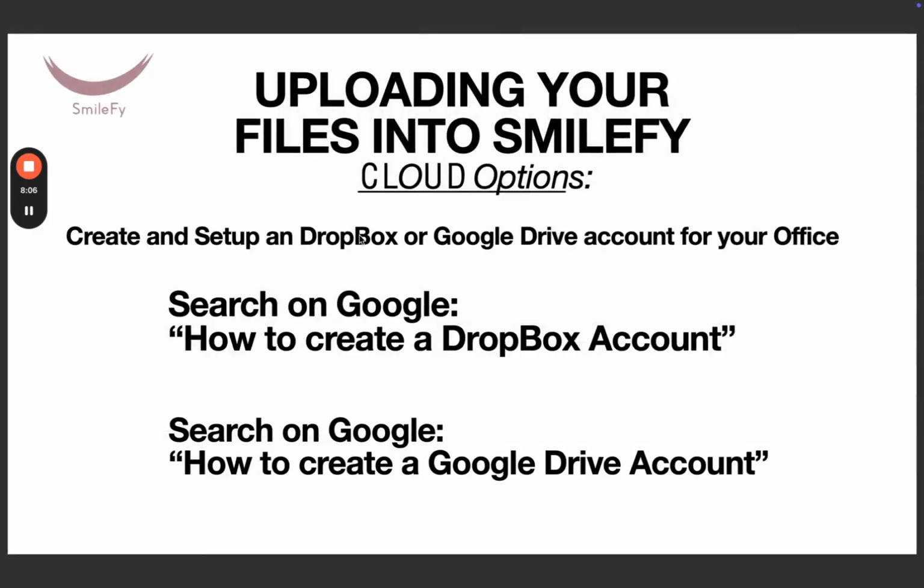Now let's talk about uploading your files into SmileFy. We have different cloud options and you can use SmileFy Drive as an option, or you can also use Dropbox and Google Drive.